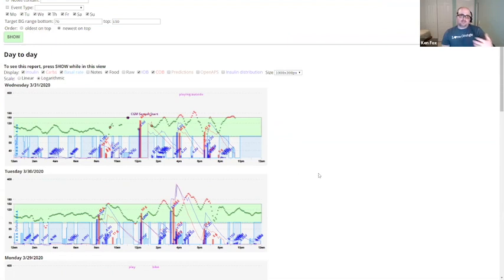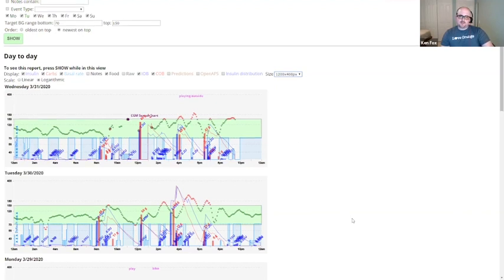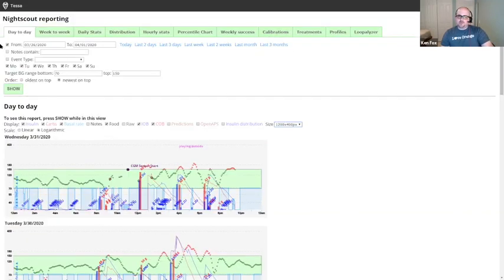I guess that fast isn't slow, but I think day-to-day report gives some really good information. I'll make it a little bigger and then print it, or take a scrolling screenshot if you have a fancy screen capture software like I do. So I'll do the day-to-day for like a week or two, and I'll usually make notes for myself. You can see the notes show up at the top. Like if I want to show her how sick days have been going, because she can't find them in our graph, which I've talked about before too. So like highlighting those kinds of things.